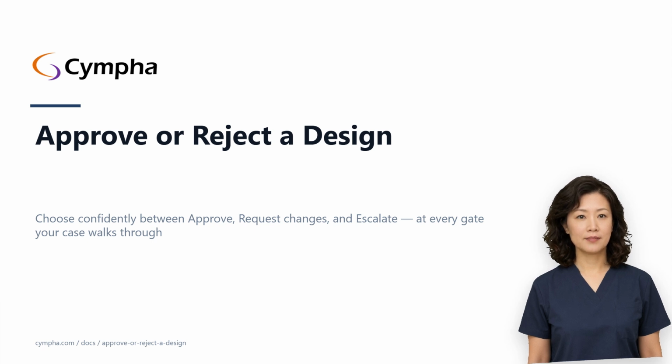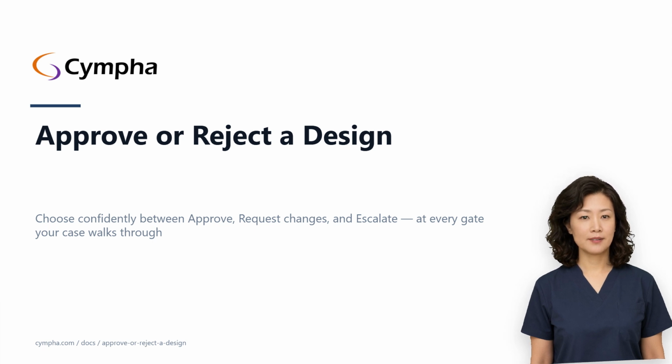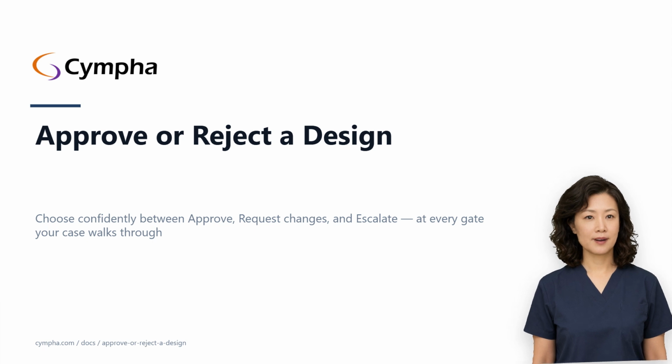2 cycles for ortho, AlignerBot, and implant cases, 1 for lab services, what the green approve button, request changes, and escalate to lab manager each actually do, why AlignerBot rejections require a structured file rather than a comment, and when to escalate versus reject. A typical review takes 5 to 10 minutes. Budget longer for an AlignerBot Phase 1 plan you want to dry run. Follow along on screen, or listen now and read the written guide later.